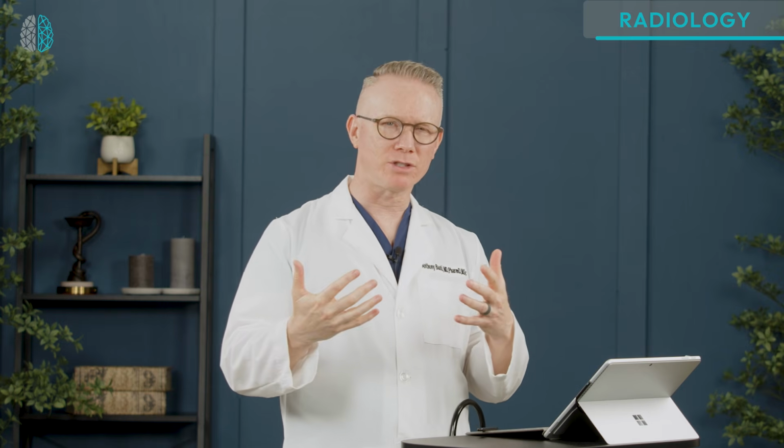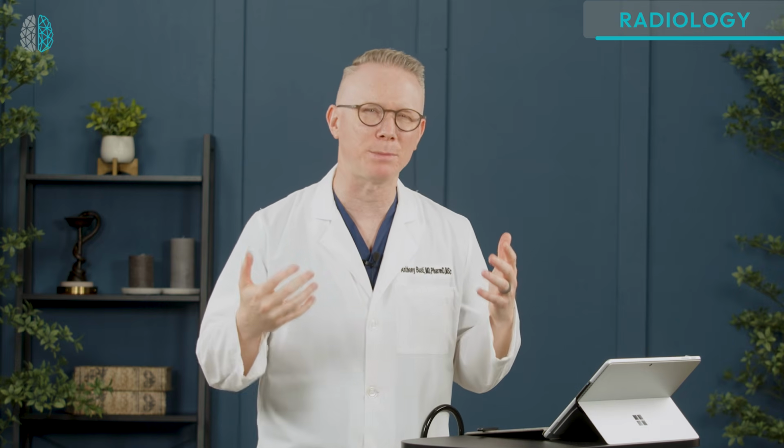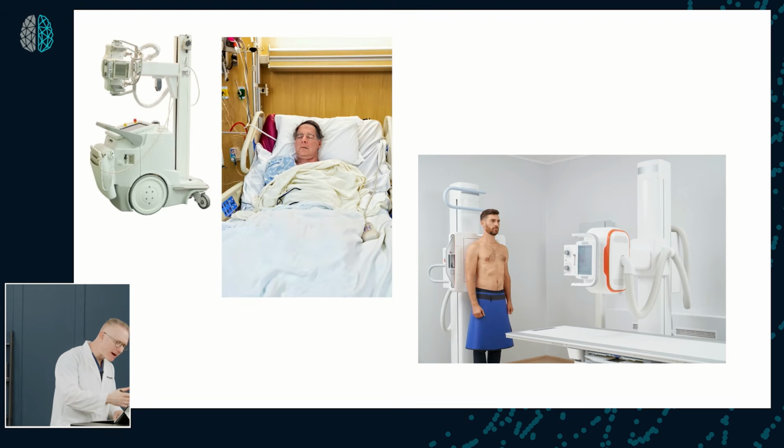So what about this posture? Thinking about the patient being erect versus supine, why does that matter as it relates to positioning? So again, coming back to the patient who's laying in the bed, who's getting a portable AP chest radiograph, versus someone in the department who can stand up and be more erect and aligned perfectly for the image acquisition. This patient over here in bed, in a semi-erect or even potentially supine view, can hide things like pleural effusions and a pneumothorax, because fluid and air will redistribute differently than when you're upright, okay? That's why some of this matters.